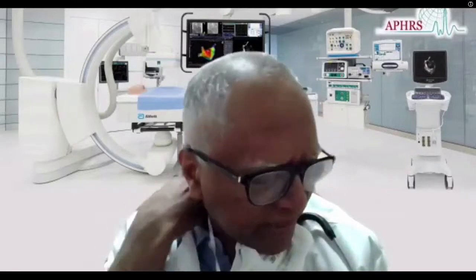Over to you, Narsimhan. Yes, a nice case. First is to highlight a couple of things. One is to pre-excite and advance. Most of this works very well when you try to deliver the PACs from the right atrial appendage. And if the right atrial appendage doesn't advance the V very well, but the CS advances it easily, then the pathways are more likely to be in the posterior sector. Whereas if the right atrial appendage advances it, most likely it is the classical location, which is the posterolateral location.